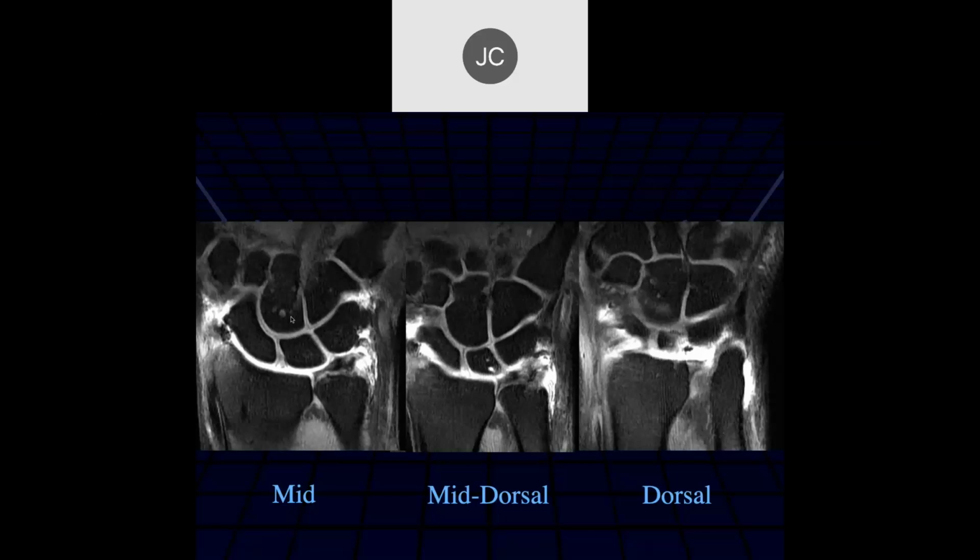This is an arthrogram. It looks like there's irregularity at the TFCC. So there's TFCC, I see some irregularity at the mid-dorsal portion? But do you see it well? No. Feel comfortable with what you see? Why do you think you don't like the images? Palmer goes back to '81, before MRIs. Right, right. So that was arthroscopic.